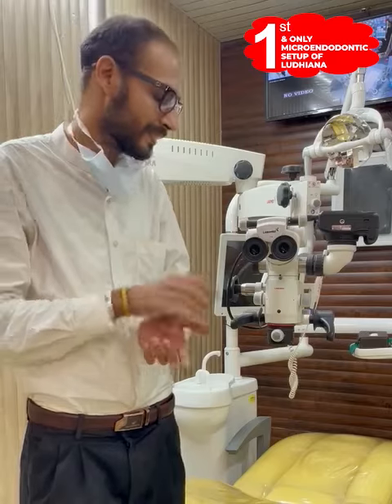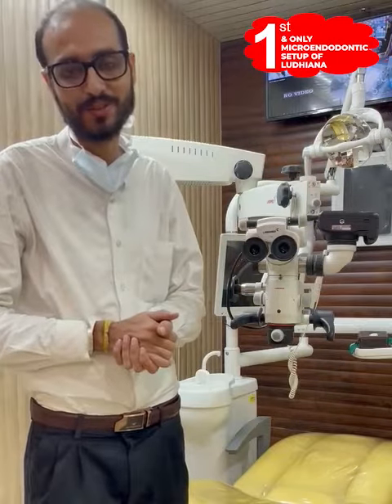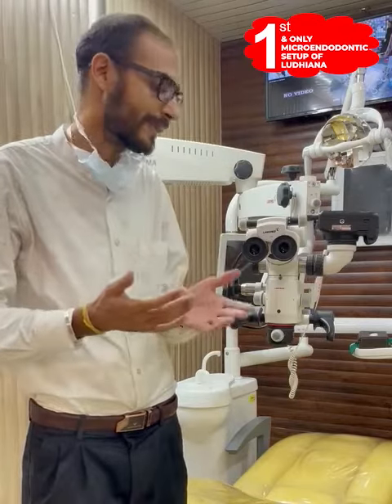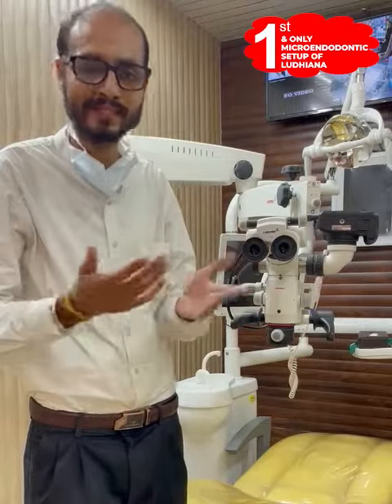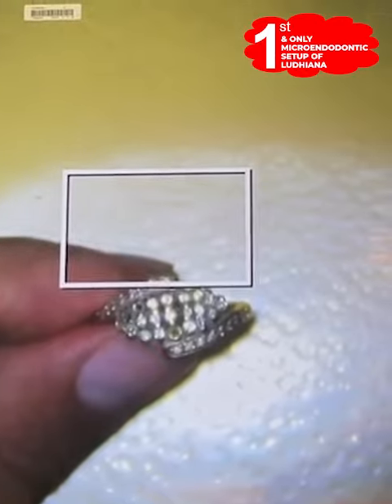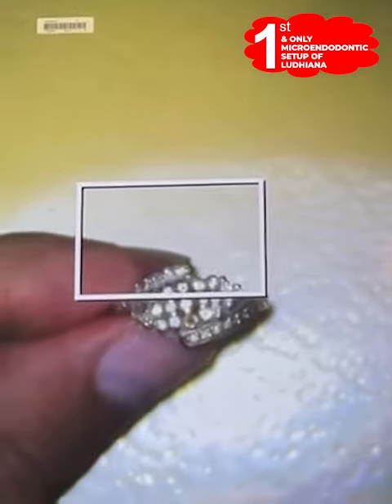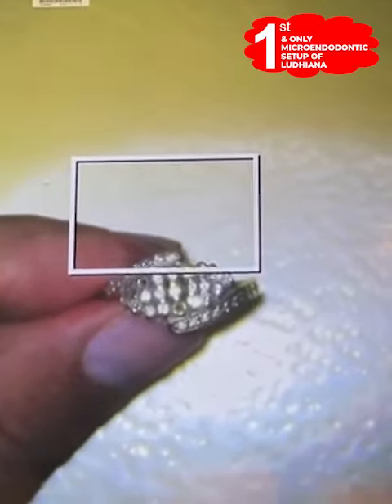So this is the device that I have been shouting about for the last 2 months, to get yourself treated and examined under. I'll try to explain the importance of this device with an example. Let me show you by a simple example. This is a diamond ring. You can see something missing in this. This is the lowest possible magnification.